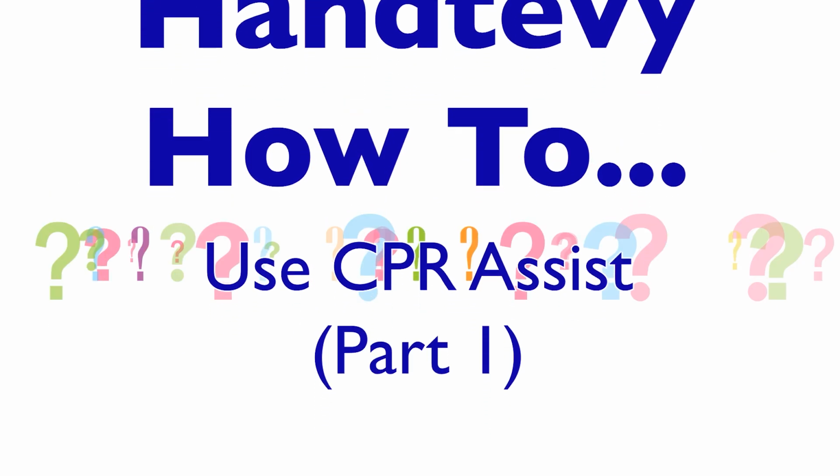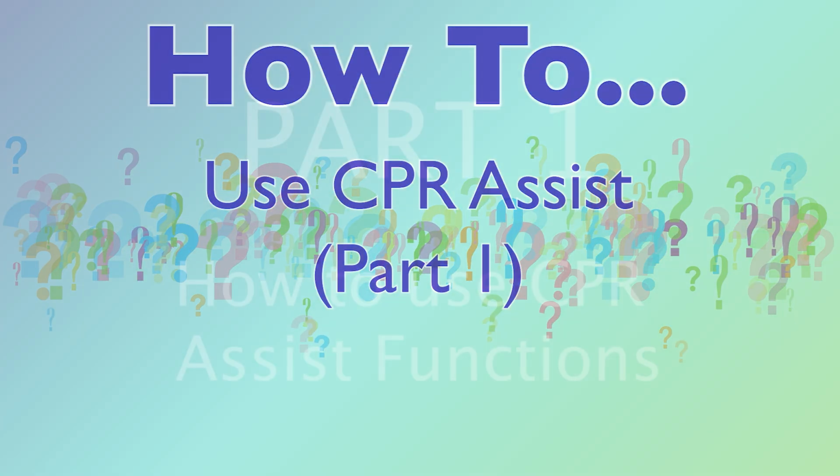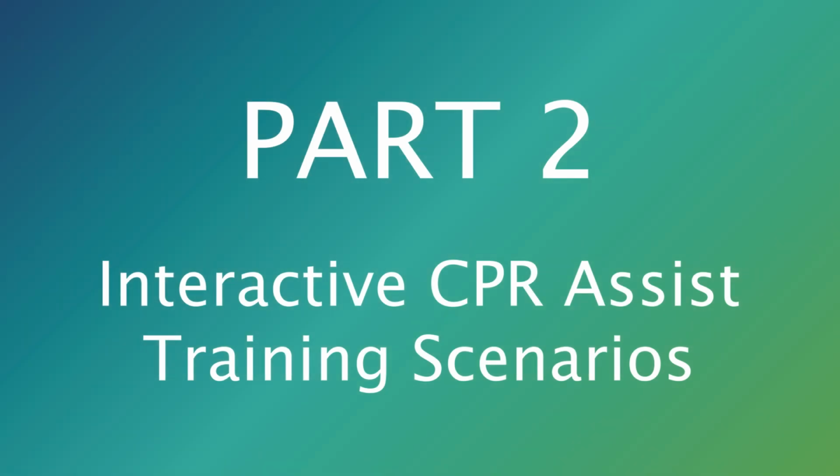In this video, we will cover how to utilize the CPR Assist function in Handtevy. This is part 1 of 2, where we will discuss the features and how to integrate them into a working CPR. Part 2 will combine the CPR Assist in real time with a code that you can follow along with.